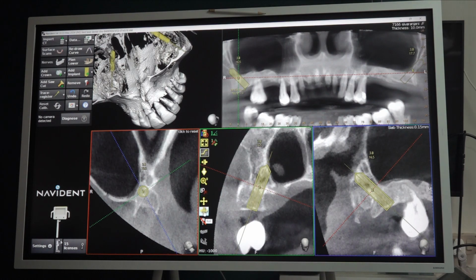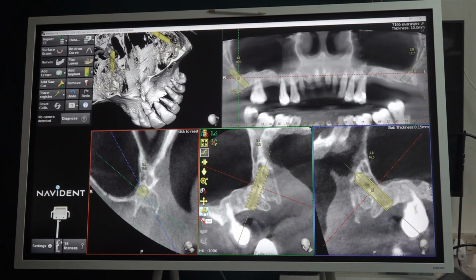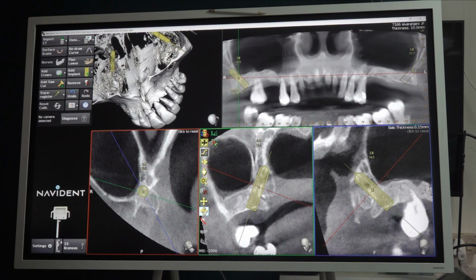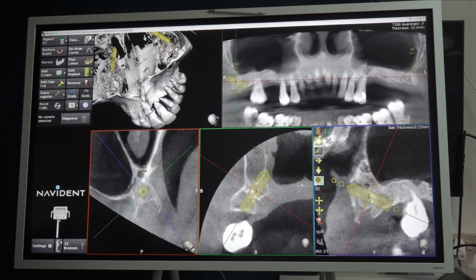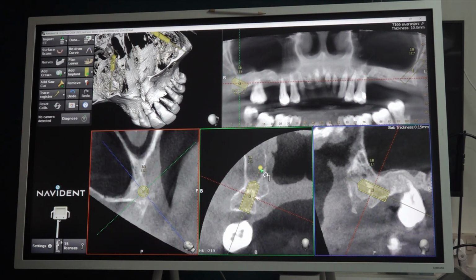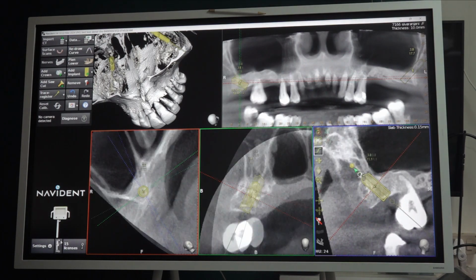Okay, so it's in 360. If you go more distally, what will happen? The length will reduce. It will be like this, and not good quality bone also. So our drilling should be correct.